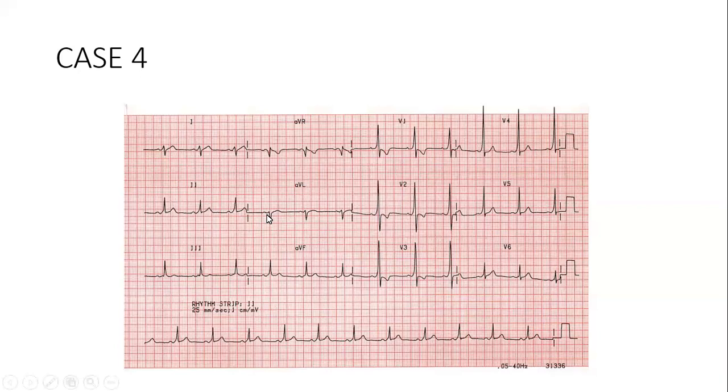He's totally correct. This is a Wolff-Parkinson-White syndrome, which is a pre-excitation syndrome. So what that is, it means there's an accessory pathway from your SA node that bypasses your AV node and goes into the ventricle. Some literature calls it the bundle of Kent.